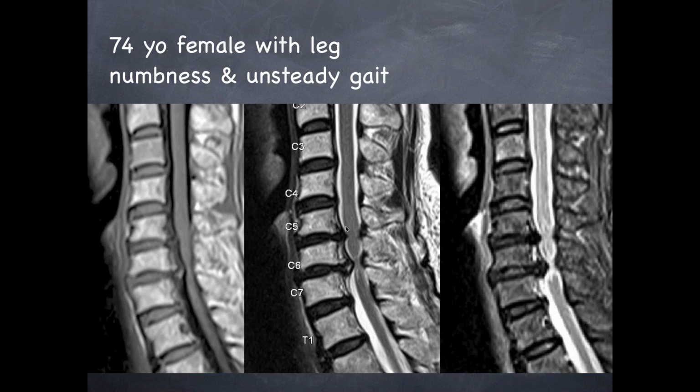And therefore, there tends to be a little more recognition that surgery for large disc herniations in the cervical spine may still be indicated to protect the cord. You can't see it here very well, but there's a lot of increased signal intensity within the cord on the STIR image, especially right in here, which we can't see very well on our projection on this screen, but on my computer I can see it much better.